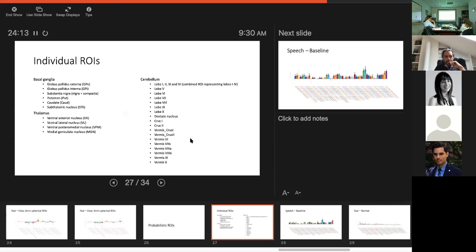So I used the split command to break the atlas up. Now, if the atlas is a 4D volume with the fourth dimension being the different ROIs and the values being the probabilities, you should be able to run it as a single file using the WROIs option to get those weights taken into account in these computations. Yeah, maybe I can try that.